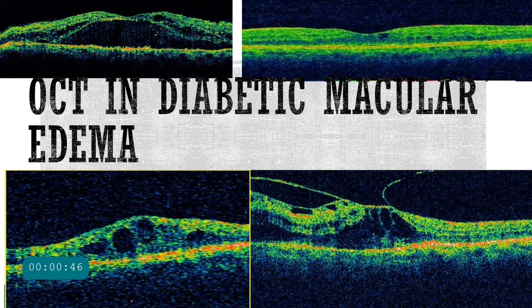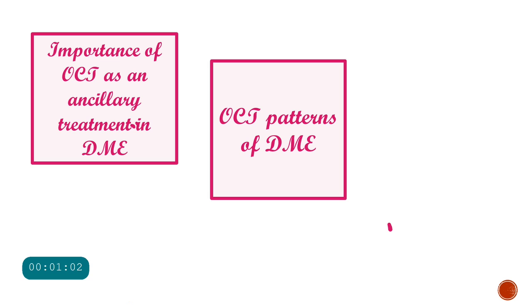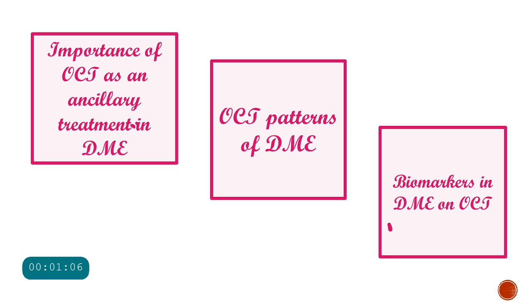Today we are studying the importance of optical coherence tomography in diabetic macular edema. So in this video, we are studying the importance of OCT as an ancillary treatment in diabetic macular edema, the various OCT patterns of diabetic macular edema, and the important biomarkers in diabetic macular edema which are seen on OCT, which will decide the prognosis of a patient and its response to the treatment. So without any delay, let's get started.